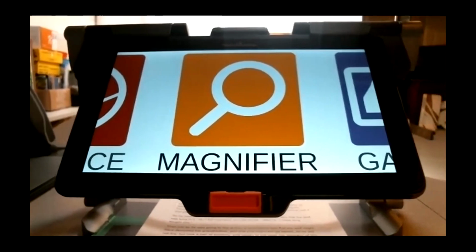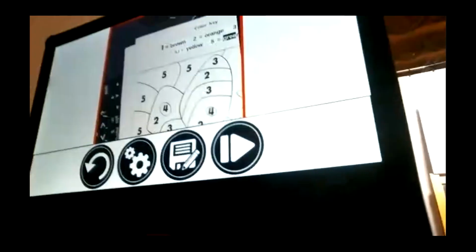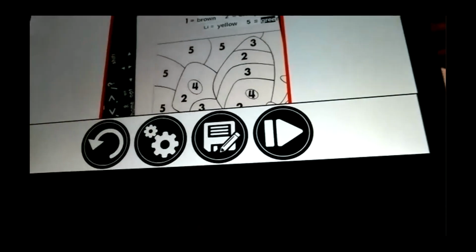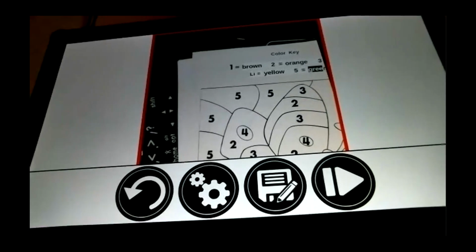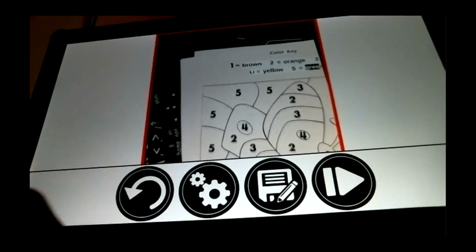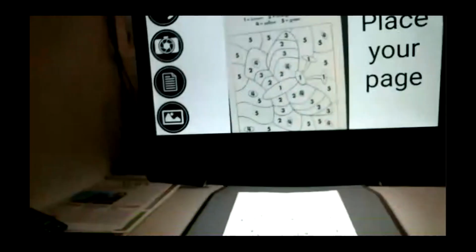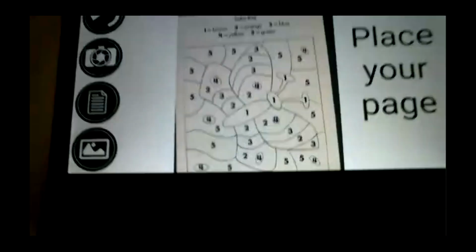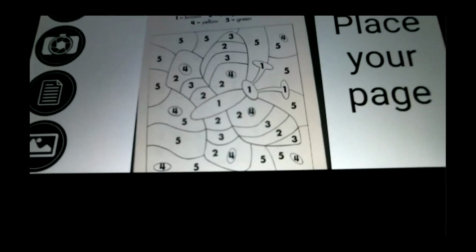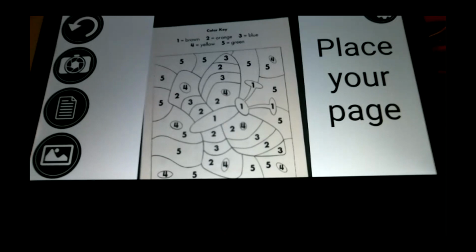Watch this. You know, when I say the Connect 12 or the Reveal 16, let's try it out with the Reveal 16. Now I know that I don't have that build. That is not a very nice build to me right now. So Prodigy on the Reveal 16. The Reveal 16 is really a foldable CCTV with a bigger screen, a 16-inch screen, but it has Prodigy on it. It has all that intelligence. I'm just going to try to get more of that screen in the camera here.